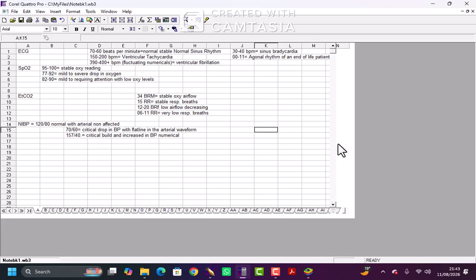As you can see here, I can create my own custom scenarios with those ranges, or any other numerical values I can choose for my custom scenarios if I wish.